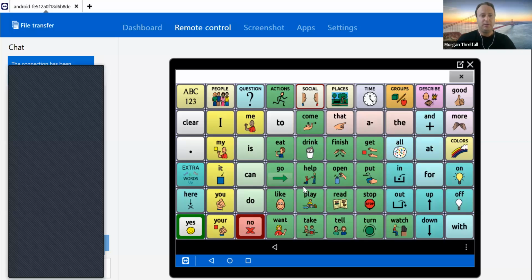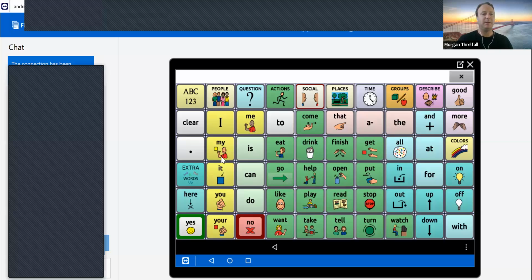And so they used a Fitzgerald key way of organizing language. So that's having our pronouns over on the left. And then they've added some colors in there to make the pronouns stick out. And they copied this from the original PCS symbol coloring.